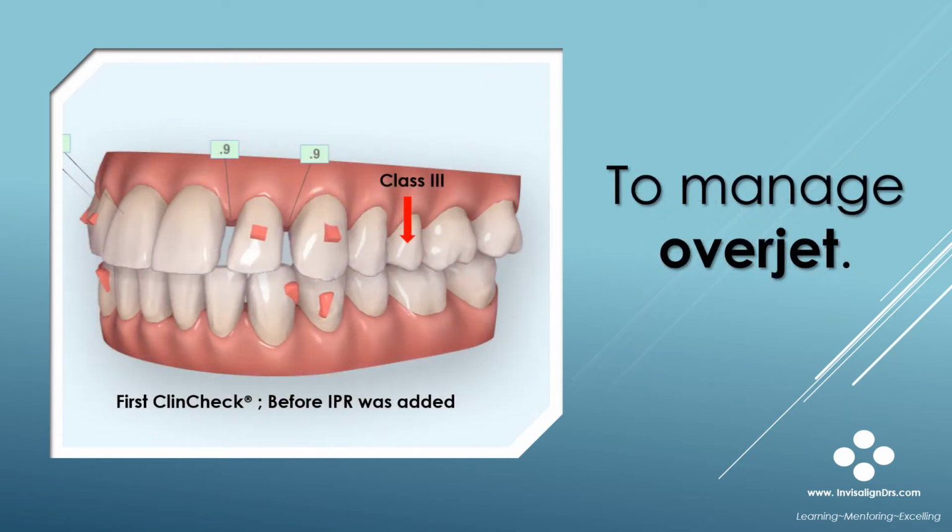IPR may be needed to manage overjet. Here's an adult Class 3 case. Now this is the first ClinCheck that came back, and I don't allow IPR for the first ClinCheck, so upper arch space was added to finish with positive overjet. In order to close that spacing, you would have to add lower IPR.